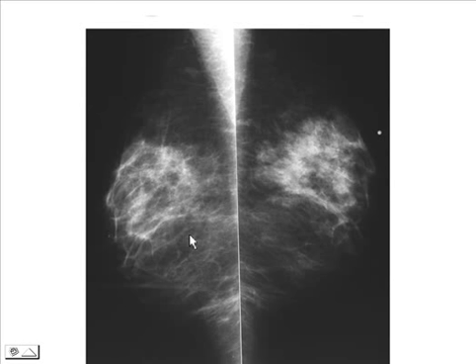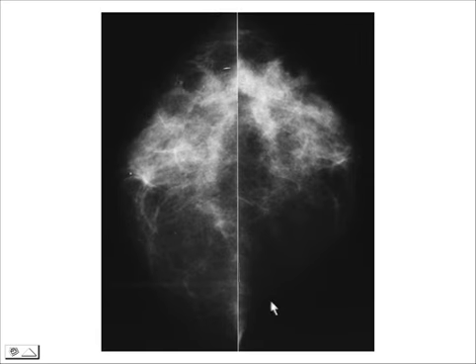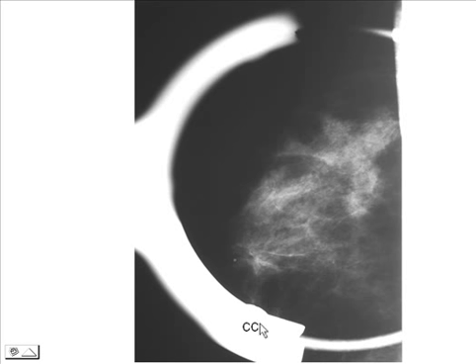Again, another mammogram, the medial-lateral oblique views of the right and left breast, a metallic marker placed over a region of palpable concern, where honestly, I don't see any big difference on the mammogram between this breast and the unaffected side. So to further evaluate that, and here are the cranial caudal views, as I said initially in the indications, we always do an ultrasound for evaluation of a palpable mass. Even the spot compression views in this case, unlike the others, didn't really help us out very much.